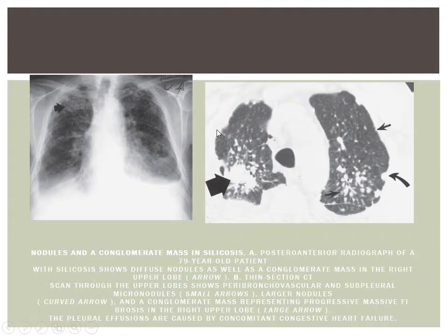So you can see there are multiple nodules in the lung, in the X-ray, especially in the mid and upper zones bilaterally, the more severely affected lung zones. You can notice the trachea is deviated to the right side, indicating some fibrotic traction changes.